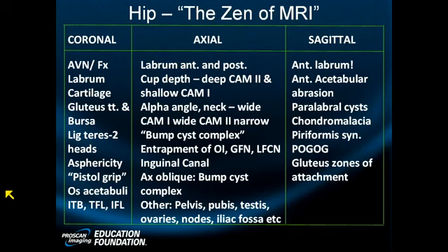But here's another paper that shows you a slightly different descriptor, that 10% of people have a sulcus prominent antero-superior, 12% posterior-inferior, and then so on down the line. So where it is in the clock face isn't necessarily going to get you out of a jam as to whether it's a sulcus or it's a tear. There are going to be other subtle and not so subtle reasons for you to choose one over the other.